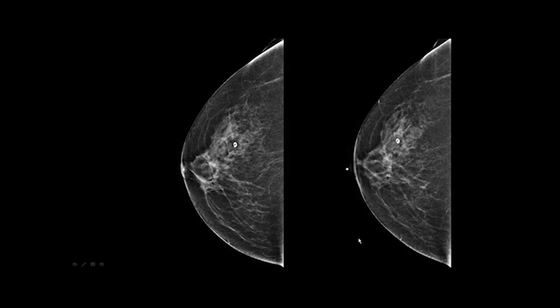So here's another example. The same patient. These two images were taken at 2 different times, but the same year. So can you see a little difference in either one compared to the other? They're both positioned pretty good. The nipple's not perfectly in profile here as it is here. Good medial tissue. So I'll give you a minute to look at it before we talk about it.